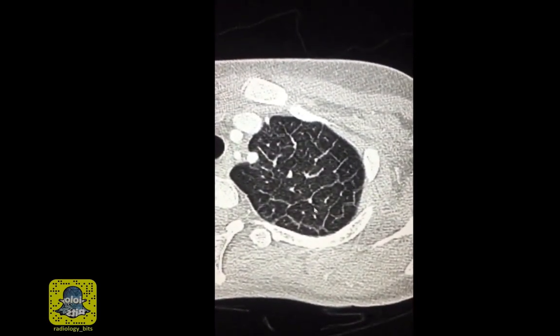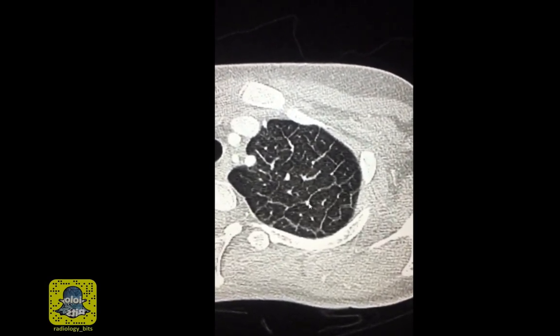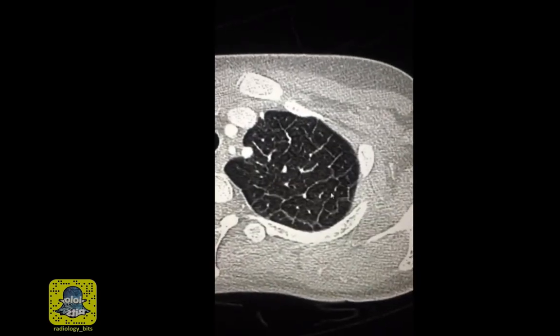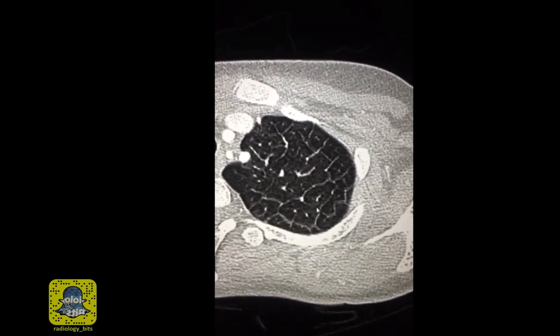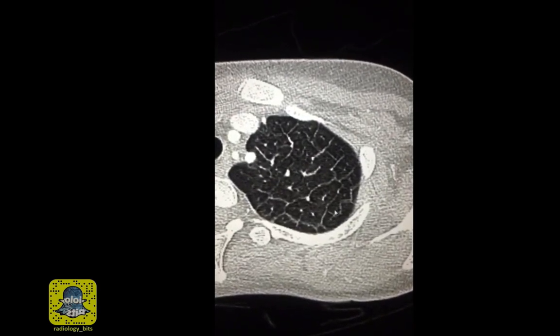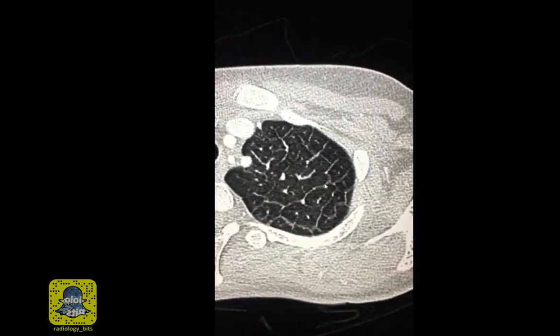The septal lines are connective tissue structures that form the backbone of the lung. So what you see here is the smallest building block of the lung. Septal lines are also seen on chest radiographs as what we know famously by the name of Kerley B lines. Whether you're seeing Kerley B lines on a chest x-ray or these septal lines on a CT scan, they're not this obvious unless they're thick.